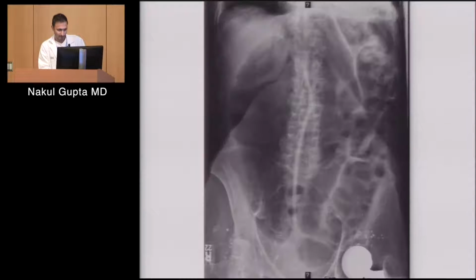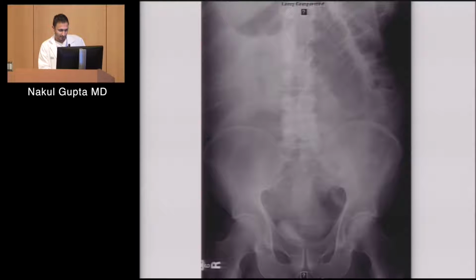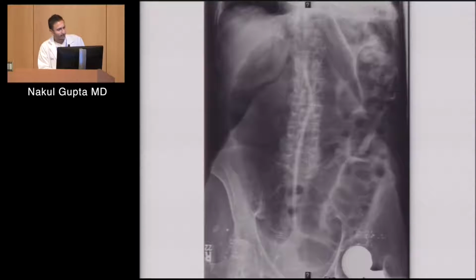Let me see what's next here. All right, look at this one now. What is happening here?